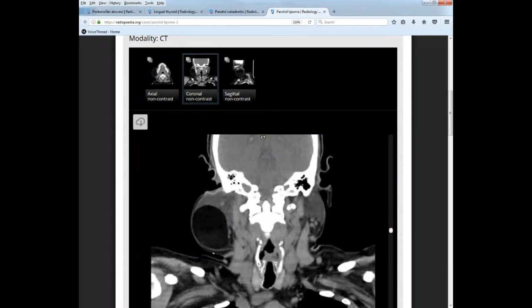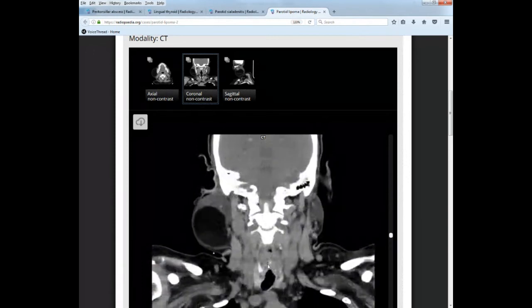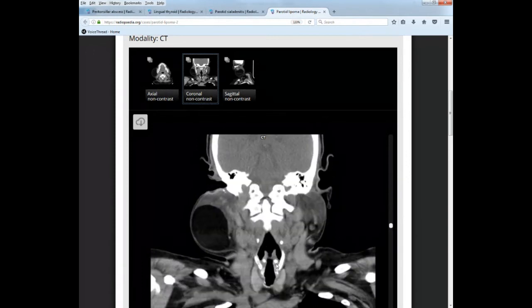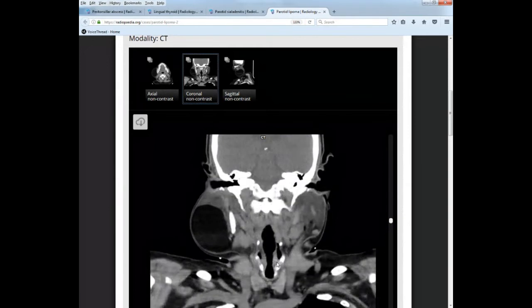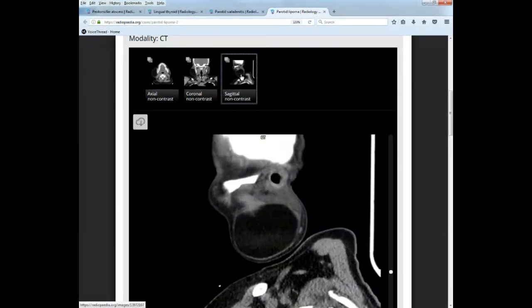Thyroid. Posterior, here's my cricoid that has come around to the back. Right here, cricoid. And then these little hooks are your arytenoid right here, coming off of the cricoid. Okay, so those are your cartilages in a different view.